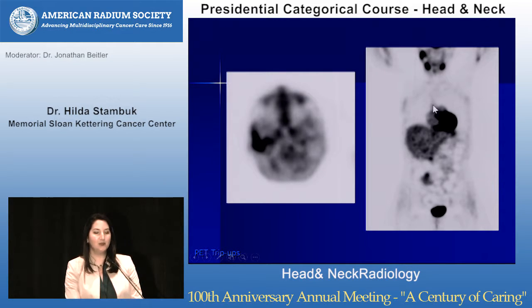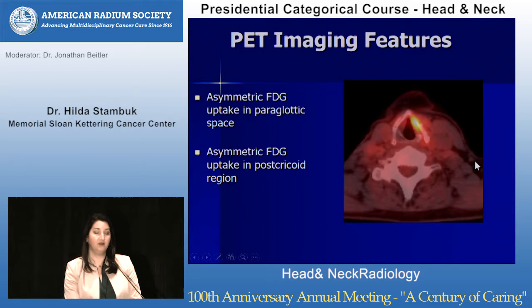So this is another case that was brought to me. This is a patient that had lung cancer, was treated at an outside institution. I was told that they have diffuse tumor involving their right parotid gland, and this is to remind everybody that FDG likes to go to the heart, the liver, excreted by the kidneys, but goes to the salivary tissues, so the problem here is not what you see, but what you don't see. This patient did not have a parotid resection or a palpable lesion, and so it was just fatty atrophy.